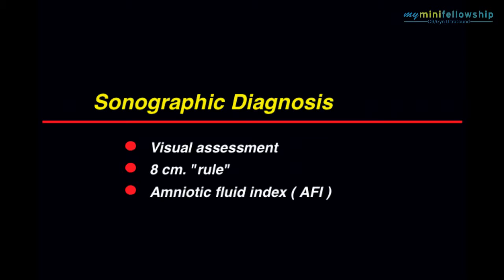Now, hopefully, you weren't sitting there bored that day and thought to yourself, you know, I haven't said the word polyhydramnios in quite a while, so I think I'll dictate that in this particular report. Obviously, there's something about the look or the measurements of the amniotic fluid that made you suspect that this was a case of polyhydramnios. And in fact, there are 3 mechanisms that have been described for the sonographic diagnosis of polyhydramnios. We are going to start with the second one on my list, which is called the 8-centimeter rule.